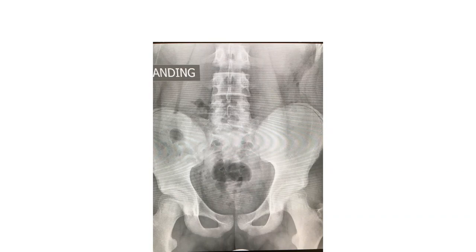Now, what's going on the top of the pelvic rings right there? Can anyone describe to me what they see across the top there? When we talk about X-rays, we want to describe. What do you see? Yeah, so you see a radiodense line, the white line. Then you see a radiolucent line, the black line. Then you see the pelvis proper, okay?